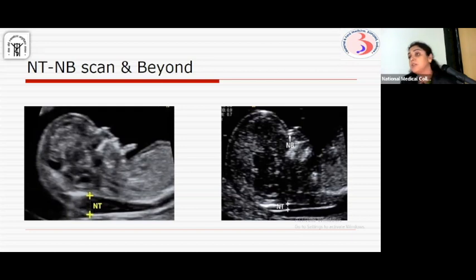It is important to see whether there are any fibroids, because later on, as the uterus enlarges, we might miss them. Or to look at the adnexa, because as the uterus becomes an abdominal organ, it may be difficult to see them. We very recently diagnosed a patient who was 7th gravida with 6 previous abortions, who came to us for evaluation of RSA. She was pregnant at the next visit, and when we did her scan, it was a bicornuate uterus. That was never looked for. So it is very important to see all these things.